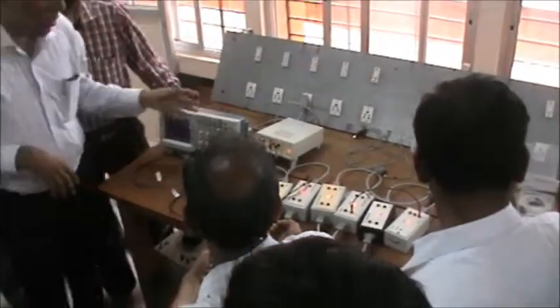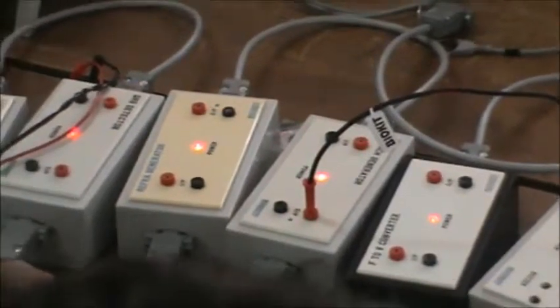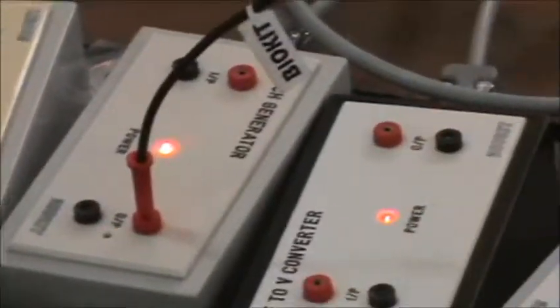So now with every ECG being detected, you have a pulse coming out. I am taking it out of a sync pulse here. So 0 and high. With every pulse that is coming, we get a beep from the buzzer. And we also have blocks like high alarm, low alarm, or an HRV module which we can connect to a sync output, and then we can even do the HRV analysis or build an alarm setup for tachycardia and bradycardia. So this is just an exploded view of a basic ECG system.